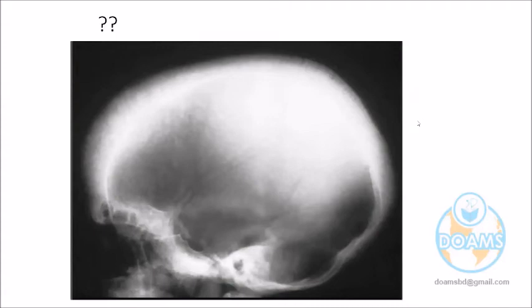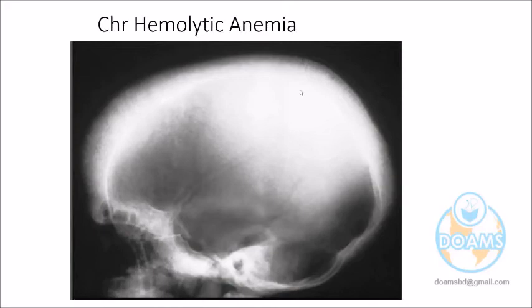This is the X-ray of the skull. What is your observation? This is Paget's disease. Yes, I think so. What are other colleagues thinking differently? Please share. Sun ray appearance, chronic hemolytic anemia, or hair on end appearance, hair on end in hemolytic anemia.